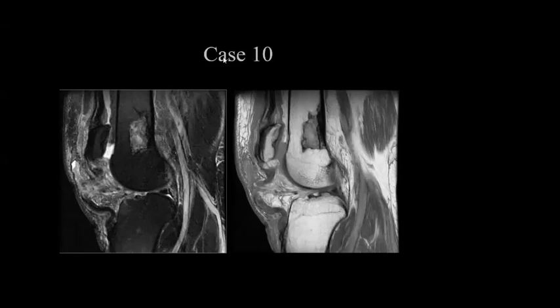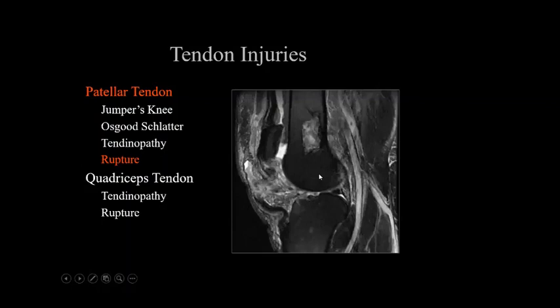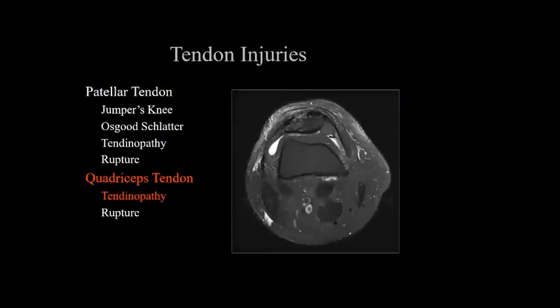Yeah, someone messaged us here on the chat. يعني overdose of analgesia. Steroid, yeah. So this patient has had steroid therapy, and because of the steroid therapy, we have bone infarct as well as the patellar tendon rupture. Okay, so this is a risk factor for both. All right, okay, so that was the patellar tendon rupture.